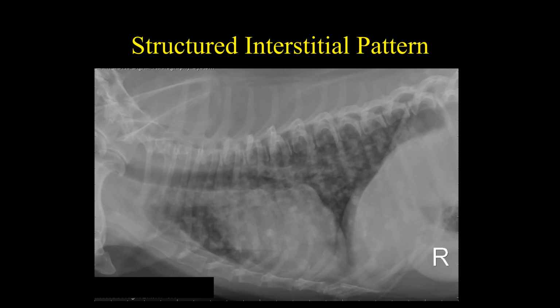Okay. So in some ways with this dog, if he's got metastatic lung disease already, does it really matter where the primary tumor is? It really doesn't, because the prognosis is horrible. You can't take these out surgically. They're all over the lung.